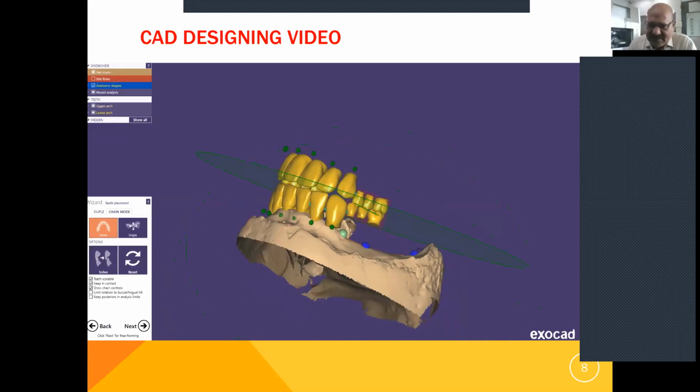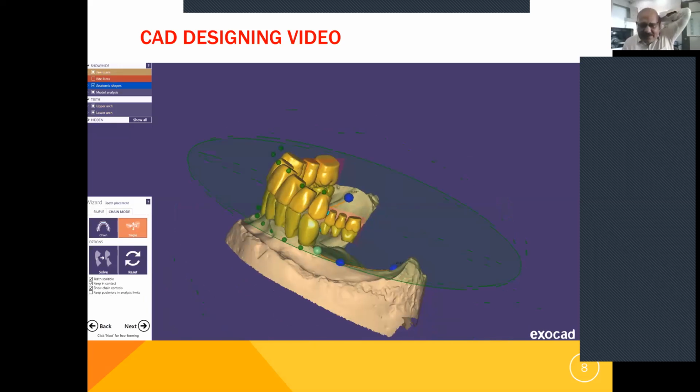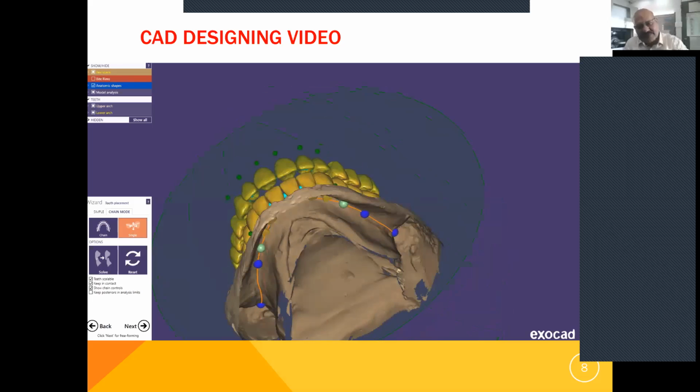We have to take up this left side. This is a bit tricky here at this juncture, so a little familiarity will solve the purpose.